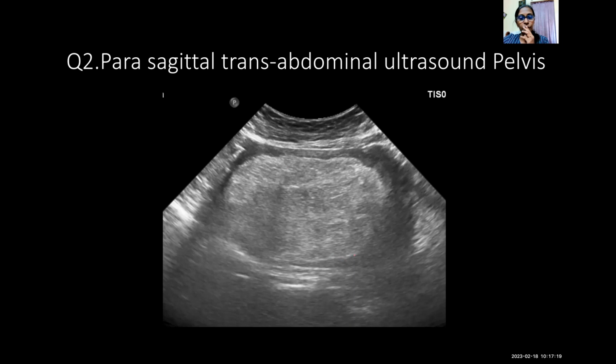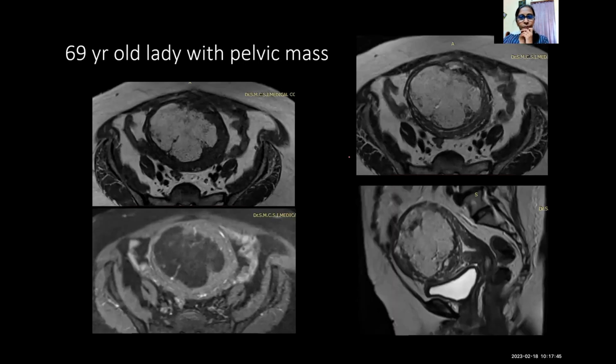Then the other thing that we look for is the lobulation, the margins of the lesion, whether it is very smooth or lobulated. That's another feature that can help us characterize the lesion. There's another finding here, which we actually had missed initially. We will come to it as part of our discussion later. So Sadaf, next set of images for you.